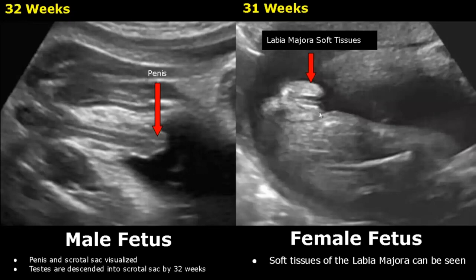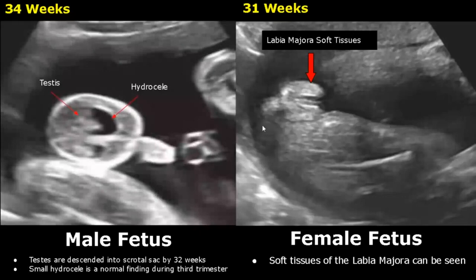And over here we have a female fetus of 31 weeks. We can see the soft tissues of the labia as well, along with the hyperechoic lines. This is an image of a 34 weeks old male fetus, and we can see the testes within the scrotal sac. Also there is some fluid outside the testes, the hydrocele. In the third trimester, such hydroceles are a normal finding.